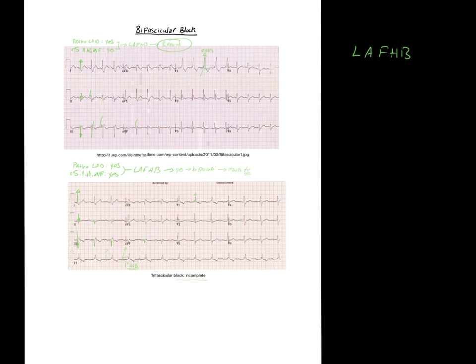They still have a lot of alternative pathways for conduction. And then let's say 5 or 10 minutes later, you run another 12 lead. So maybe this patient's having a STEMI on top of all the other things, right? Oh, you identified STEMI. Good. Pat yourself on the back. You got it. You also identified that there is a left anterior fascicular hemiblock. Wow, you're smoking hot at interpreting these things.